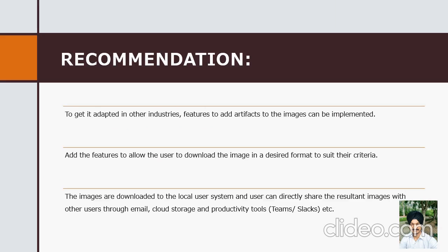In the recommendation part, image annotation tool has enough proficiency to be utilized in different industries other than the medical industry. To get adapted in other industry, features to add artifacts to the images can be implemented. The image downloading is restricted to 2 formats. One is the PNG and another one is the PNG in grayscale.